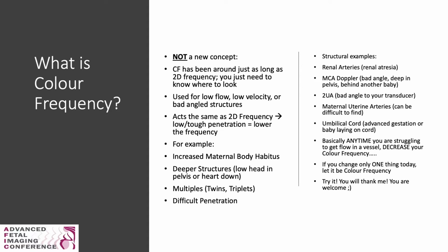What structures is it used for? We use it for low flow, low velocity, or badly angled structures. It acts in the same way as 2D frequency, which we all know how to use. So for low or harder penetration cases, we want to lower the frequency.